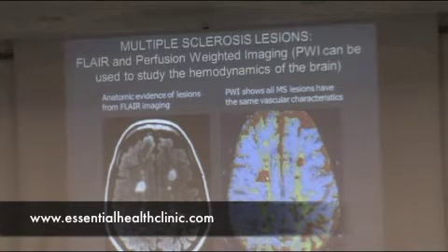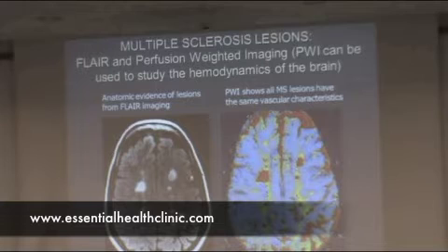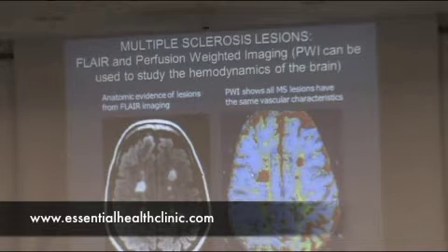And in this particular experiment, what we did is we took the information from a single region in the 3D volume of your brain, and we asked what parts of the brain behave exactly the same way as that MS lesion itself. And if there is a vascular connectivity associated with this, all the lesions should turn red like this. And you can see they do. Actually, it's quite amazing. The fact that I only chose one lesion at one slice actually highlights all the lesions in the brain. It's another indication that there is a vascular problem associated with those lesions, because they all behave the same way.